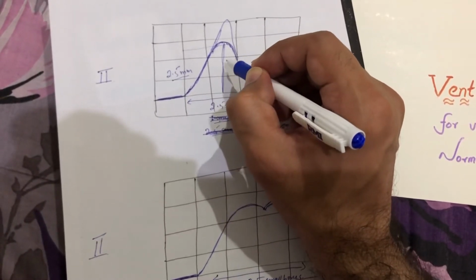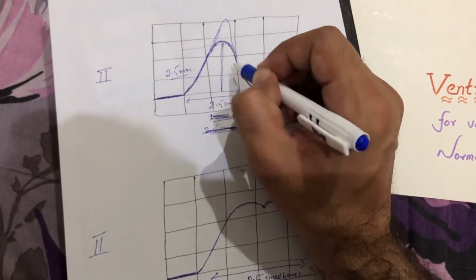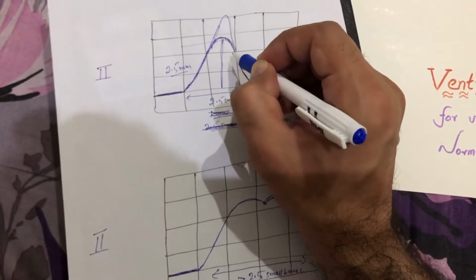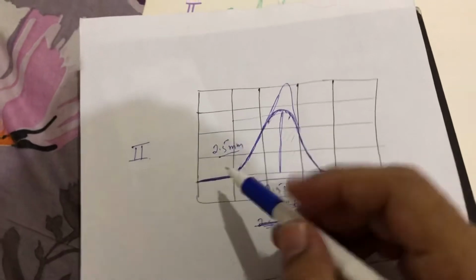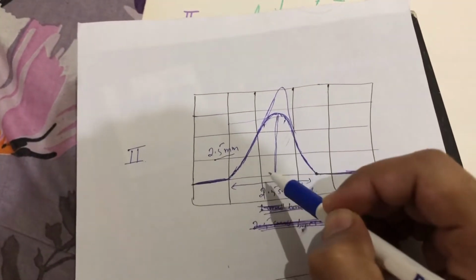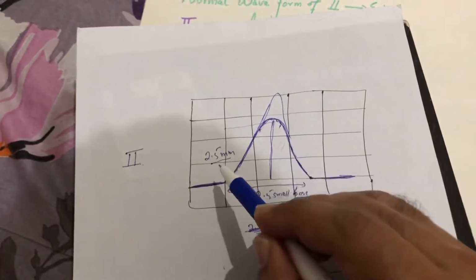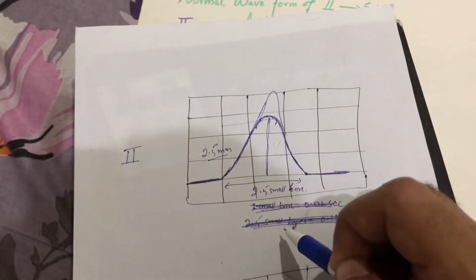That's why an enlarged action potential is required to depolarize it, and we call it right atrial hypertrophy, okay? So again, in right atrial hypertrophy, this first part of the P wave is going to be enlarged vertically, more than 2.5 small boxes. We call it right atrial hypertrophy.